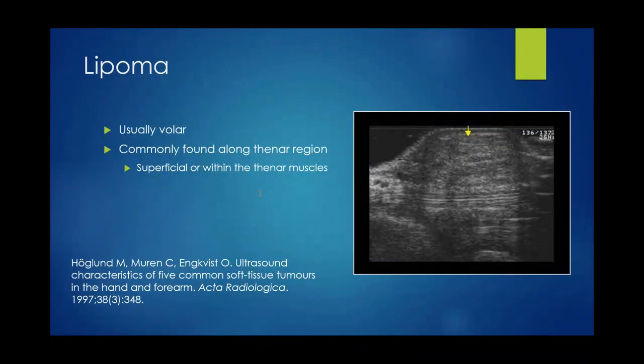The other ones, like rheumatoid arthritis or other systemic inflammatory disease processes, should be more systemic, so more than one tendon sheath should be involved. The cortical irregularities seen with PVNS denote the length of time it's been present. Typically with an inflammatory tenosynovitis, the patient probably isn't going to wait long enough to allow the bone to be involved from the tenosynovial involvement.